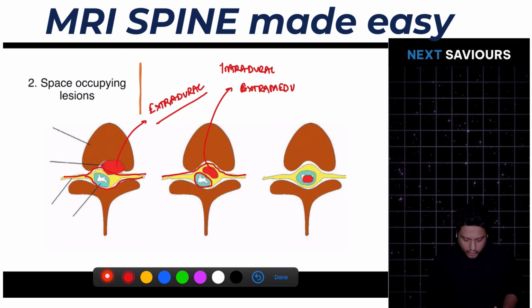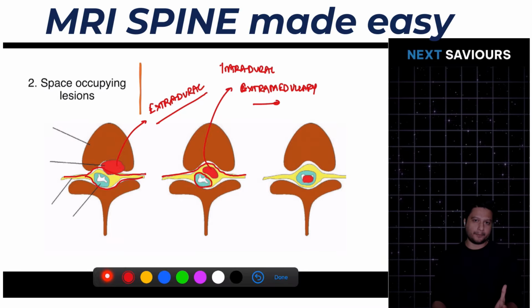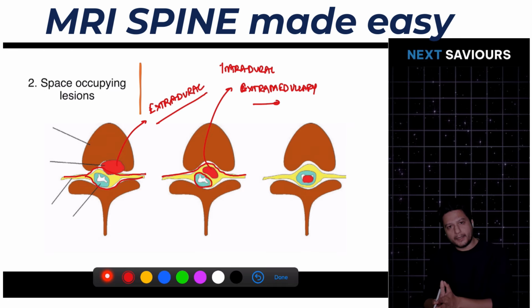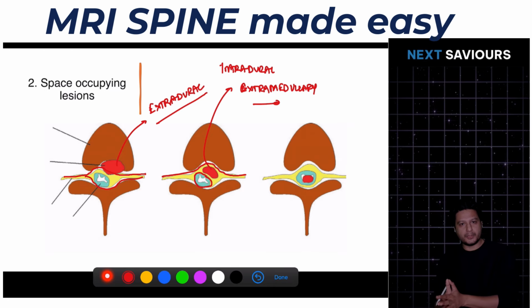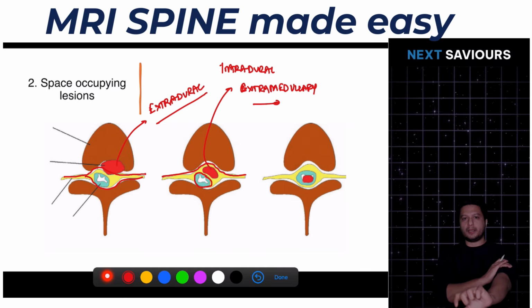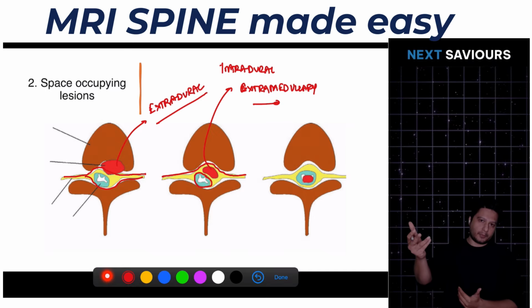Meningioma or schwannoma are particularly the tumors lying in this category. Although the diagnosis can be made upon biopsy, these are the two most common tumors found in this location, compressing the cord, not originating from the cord.